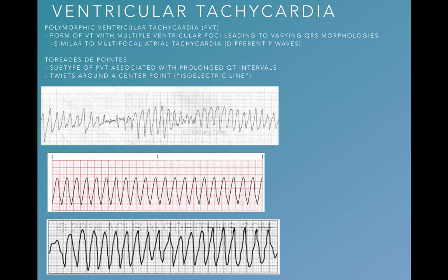VTach used to confuse me a lot, so I figured I would put in all of the different possibilities so you will not get confused on a test or in real life. I just showed you monomorphic before, so take a look at the three that I showed, and hopefully you can already point out that monomorphic would be the second picture I showed. But let me go through some of the points above.